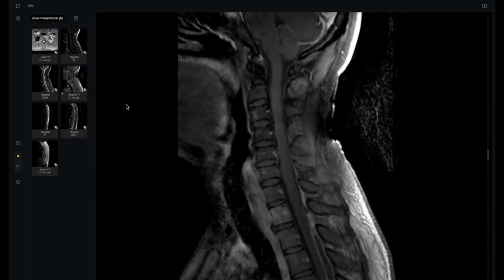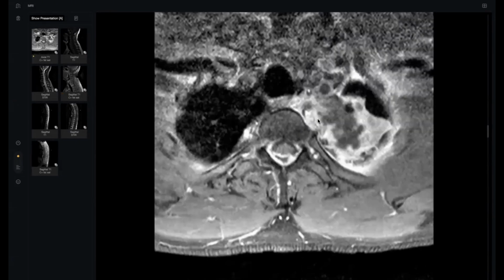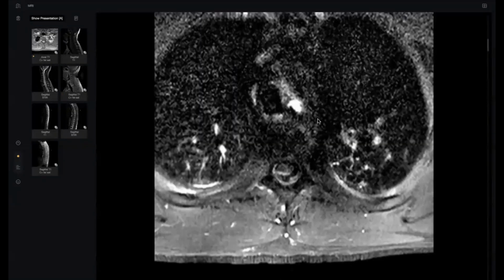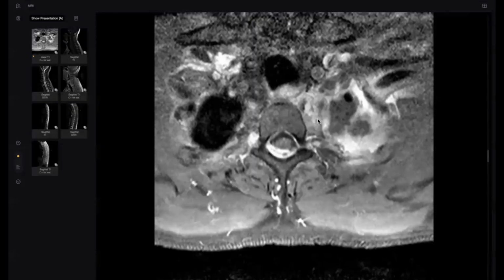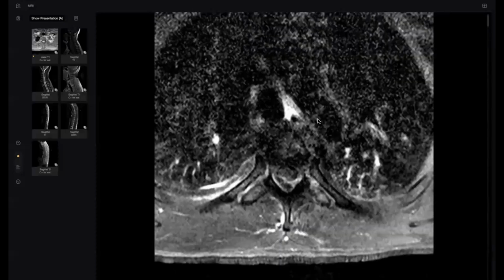Thank you, doctor, so much. This is a case of necrotizing left apical pneumonia, resulting in empyema, cord swelling and myelitis. I think one examiner may give you this axial image only, and from which he wants everything from you.